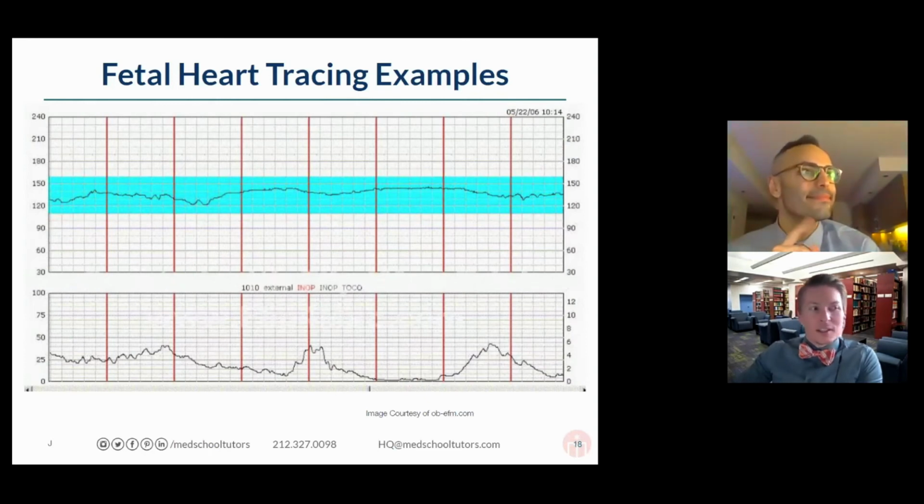I've got an answer that's getting close, asking about the possibility of seeing a decel here. So yes, this is deceleration that we're seeing in this case. Seeing a couple people say some things here in the chat, and to be honest, this one's a little bit difficult to appreciate, so I'm going to try to help us out as much as possible.